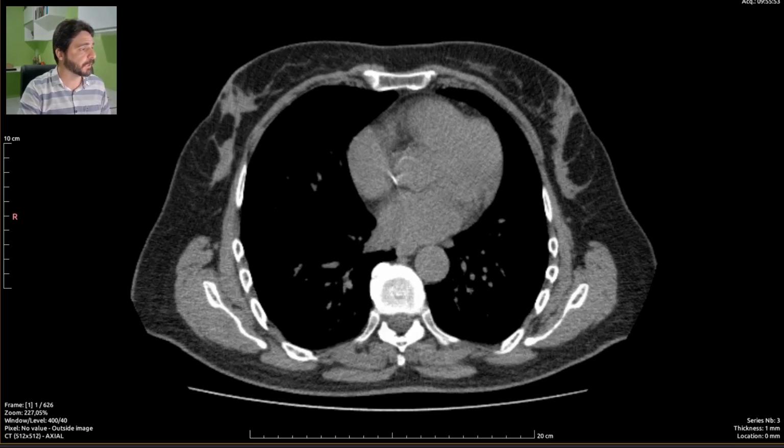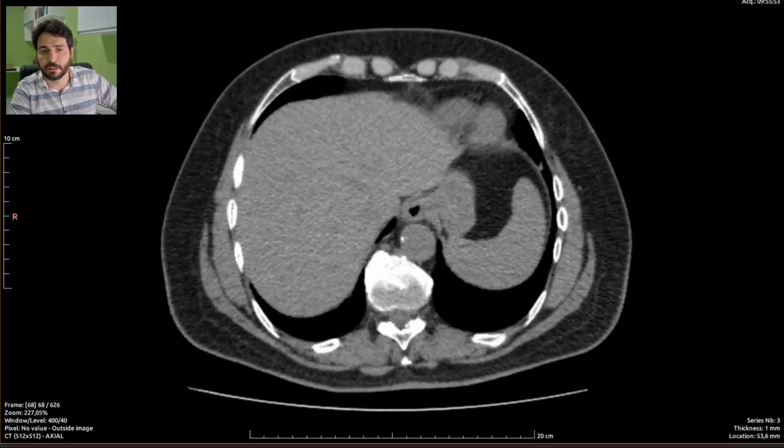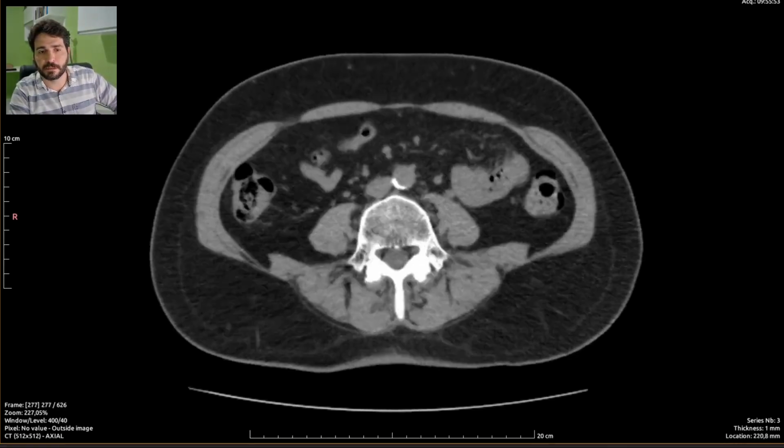So I'm just copying and pasting my template for such cases because I just want to make my life as easy as I can. No need to type in what I have already typed thousands of times. So let's go. Let's scroll this exam.